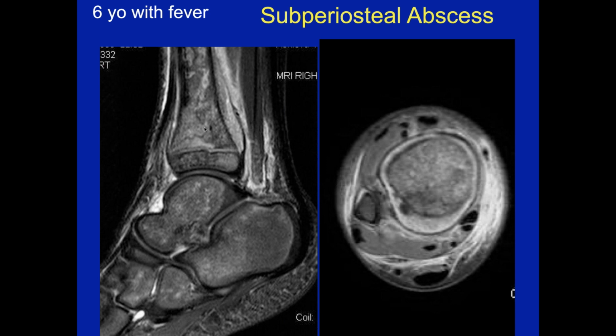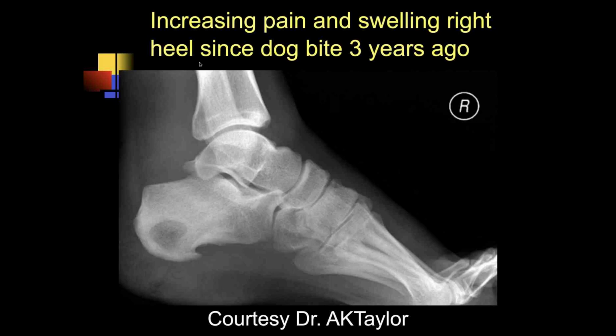So this certainly could be trauma, a subperiosteal hematoma, but this pattern doesn't look typical of trauma. You'd almost think maybe there's a double line sign. I think it could possibly be an infarct, but it is too uniformly involving the marrow space to be a typical infarct. And this turned out to all be infection with Staph aureus. Dirty looking. Yeah, right.